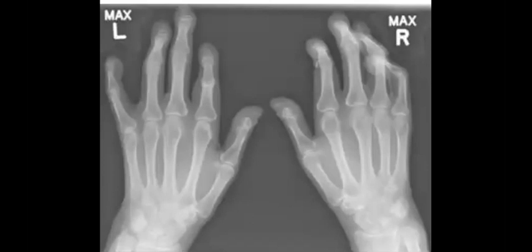If there is any further workup you will do, you will search for the history of this patient, any previous imaging. If this patient has esophageal dilatation or lung fibrosis, upper or lower lung fibrosis, it will be basal or lower fibrosis in the lung, perfect. So this is what criteria you will search for, and you will mention in your exam. Yes.